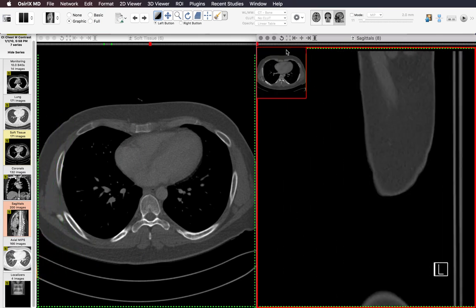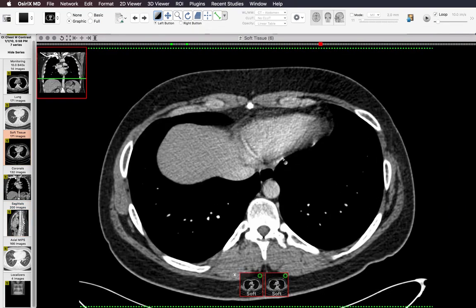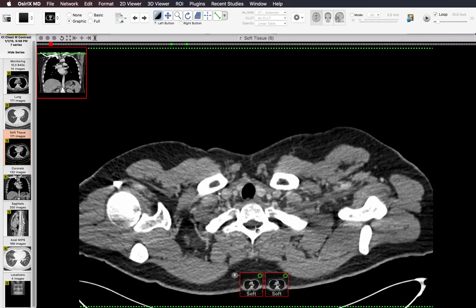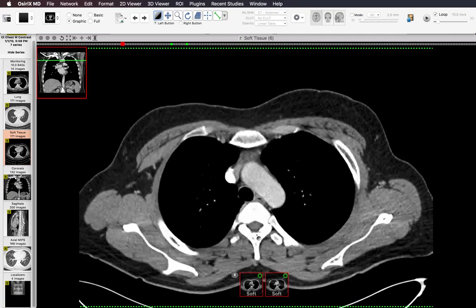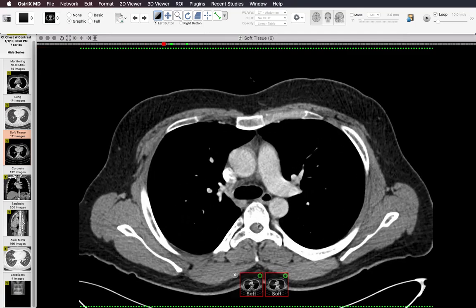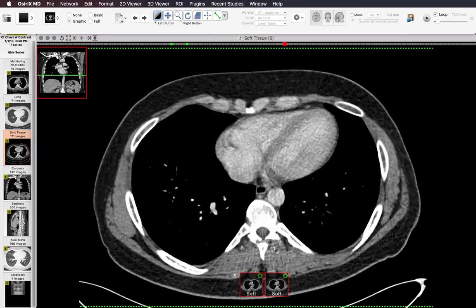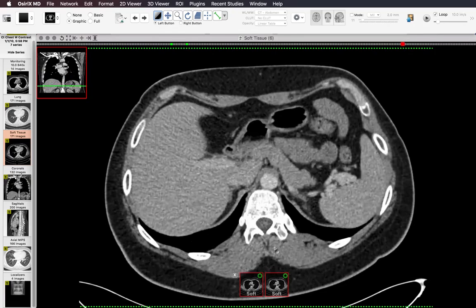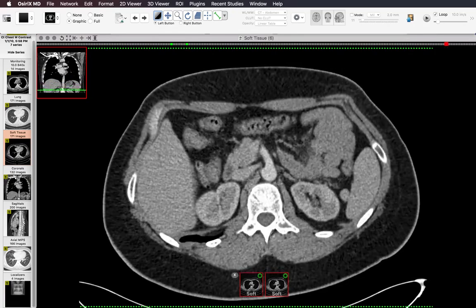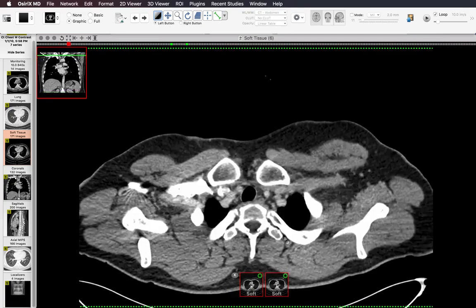Okay, so that covers the bones. Then I move on to the soft tissues. So the first thing I do is look at the spinal canal. Now this is a low yield place. Rarely will you see anything in the central canal in these patients, but sometimes you can see mets or lymphoma here, and if you do see that, then those are big consequences to the patient. So even though it's low yield, it's an important place to look for abnormality.